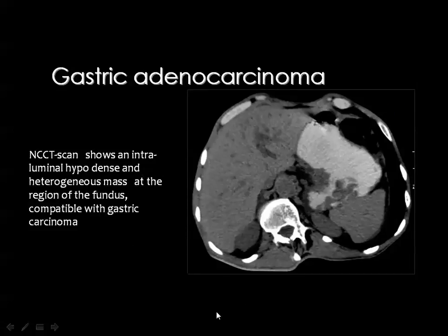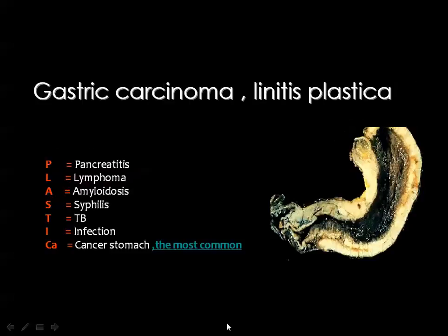And this is a gastric fundus adenocarcinoma infiltrating the fundus of the stomach, and the fundus has been reduced to this narrow track, and this is the mural part of the tumor, and here also the mural part of the tumor, and you know that this area is near the gastroesophageal junction.